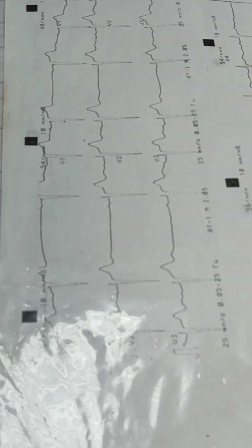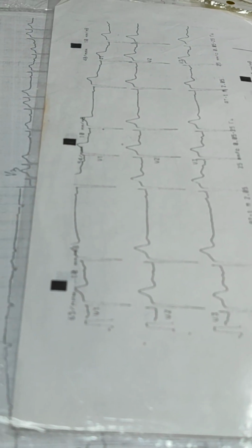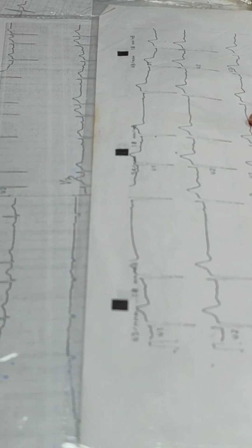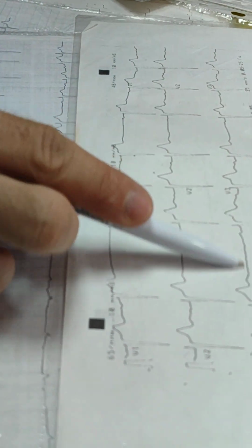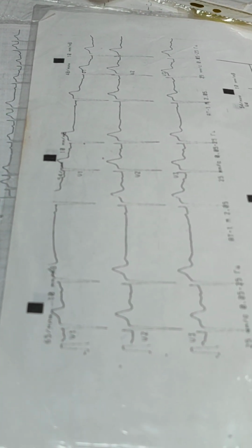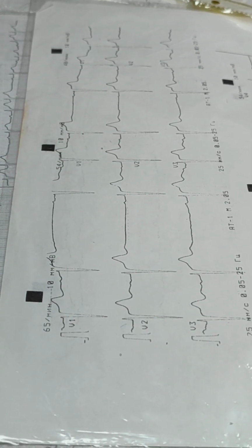In this case, where is the wrong place? Look at the card and try to find big changes. This distance is long. Next, let's check why. It could be sinus arrhythmia, SA block, or extrasystole.